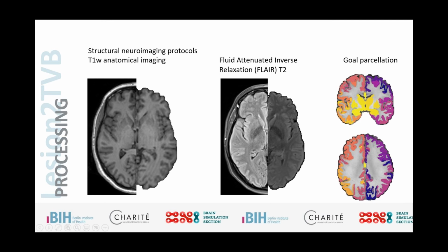So the idea is that we start with these raw image data and we end up with the fully processed structural data here. Actually, I cannot see this exactly, with the structural data here that we can then use to also create this parcellation that we have, as the ultimate goal is to have the different brain regions being represented in the subject space. So for each individual subject, perfectly following the anatomy of the subject, representing the volume of the region, location of the region, so that we can have individualized brain models at the end.